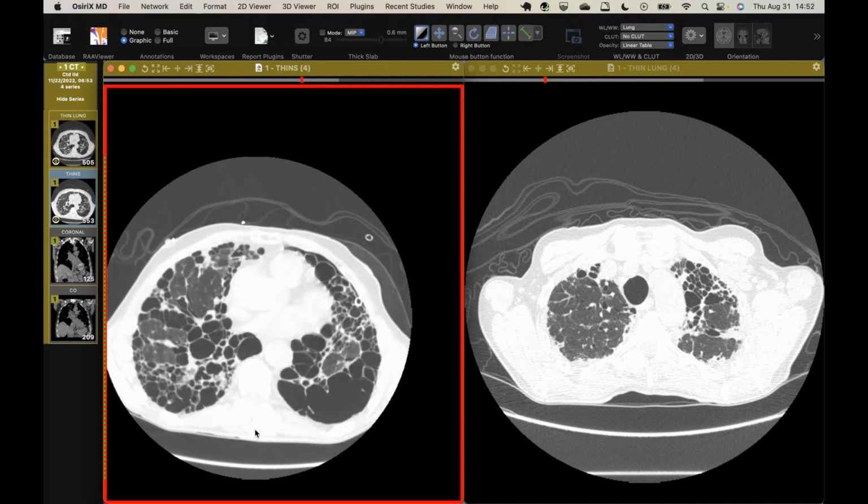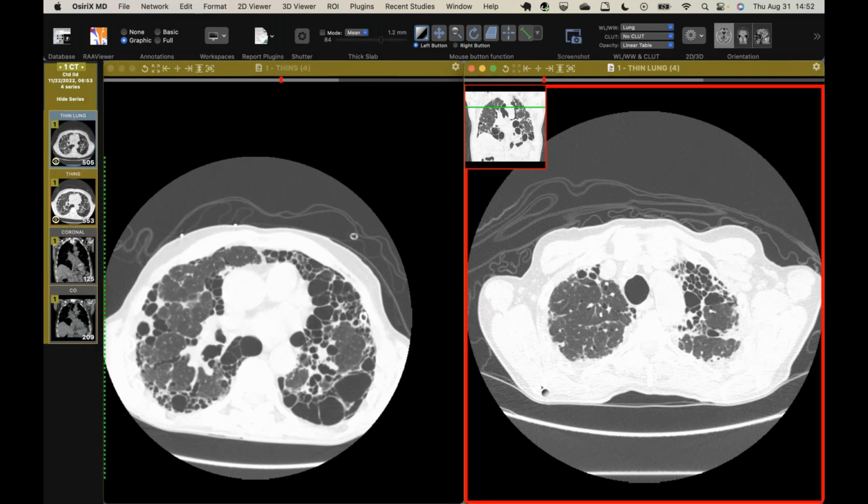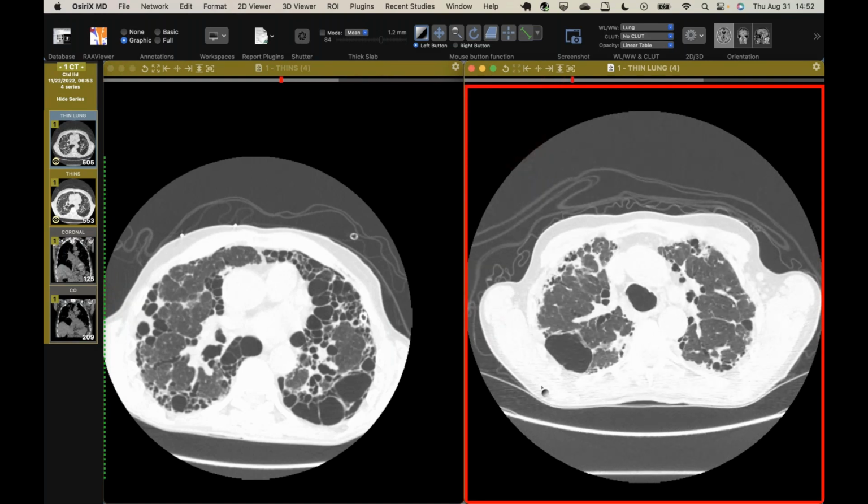I've seen this exuberant honeycombing with a mid and upper lung predominance along fissures in people with sarcoid. Yes. And I think Ton has shared some cases like that in the past that also had that finding. Yeah, I have one sarcoid case like that, but it looks almost more like paraseptal emphysema. This one is clearly not, but I don't know.